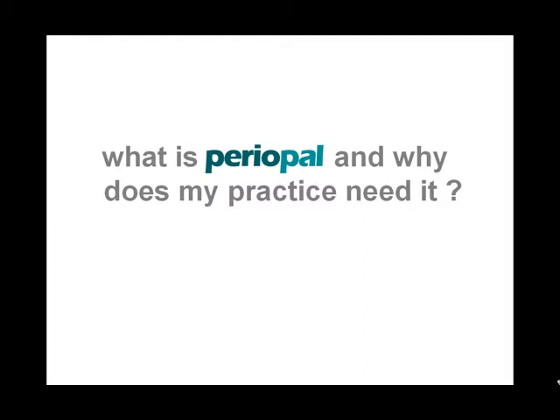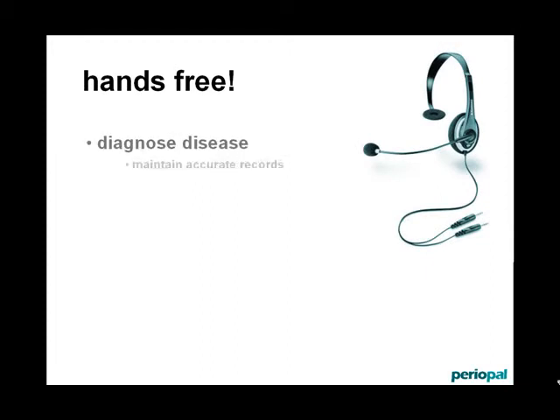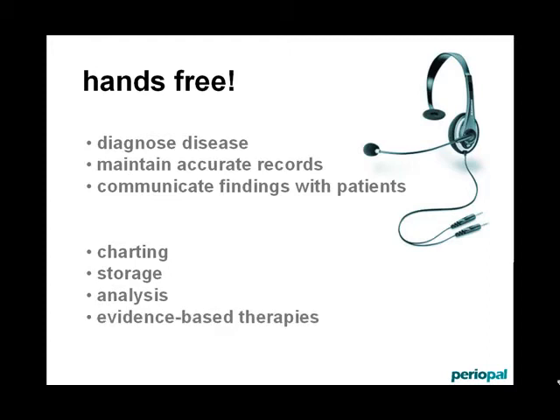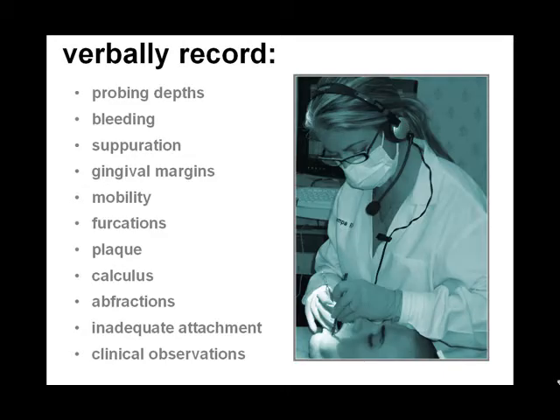Welcome to PerioPal. PerioPal is voice-driven software for periodontal examinations. PerioPal is an improved method of hands-free recording that enables the user to record more data more accurately in a single pass and do it alone. PerioPal offers the complete tools to diagnose and educate patients, as well as motivate them to accept treatment. With PerioPal, voice really works.